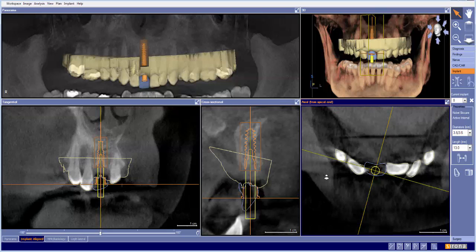Again, if we're using our checklist, there's a couple of things that I see with this plan. One is bone position. Two, I have a question on how long ago the tooth was taken out. Was a graft done at the time of extraction? And three is the buccal plate in this particular case. So there's a reasonable amount of changes that I would make with this plan.